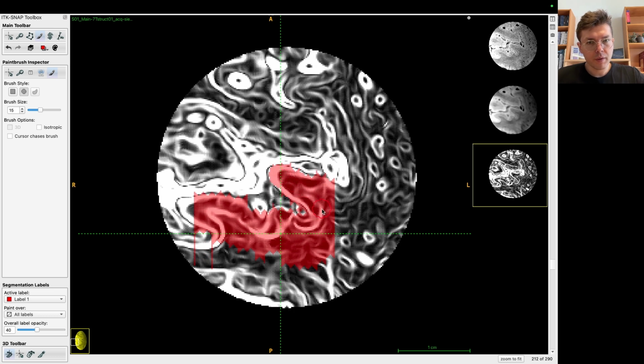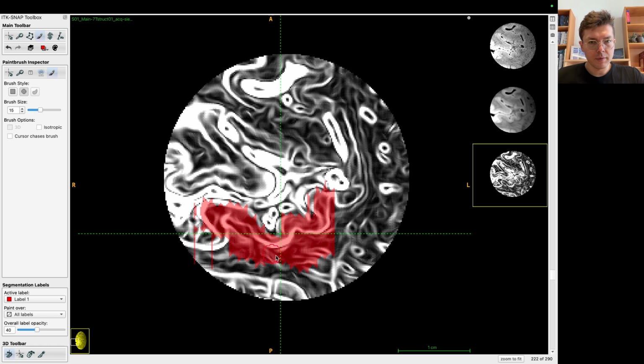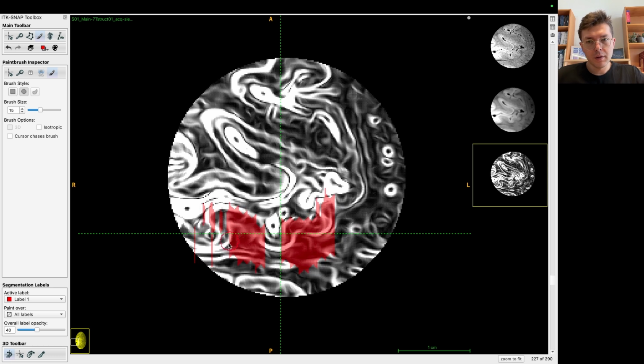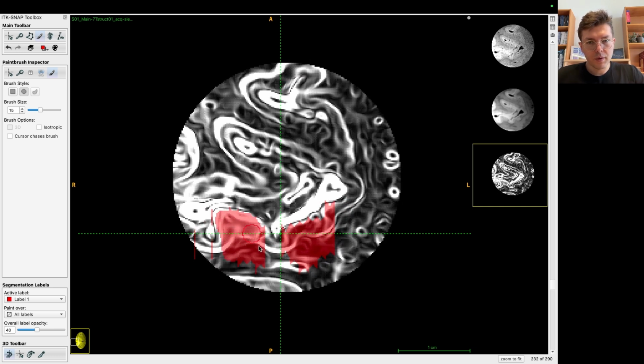Okay. Going 5 by 5. Here. I mean, probably you might be a bit slower doing it at the beginning because this is my 20th, 30th subject that I segment their Heschl gyrus using this method. I am noticing pretty straightforwardly the geometry of the Heschl gyrus there. But you will speed up very soon, actually, very fast.